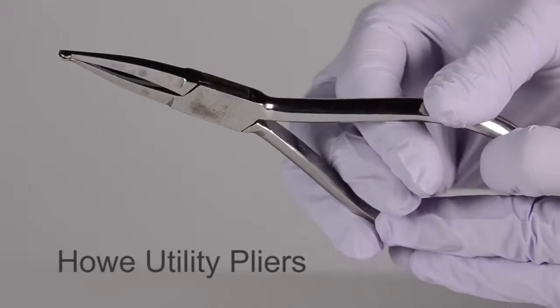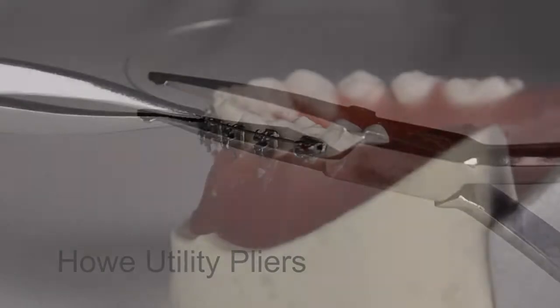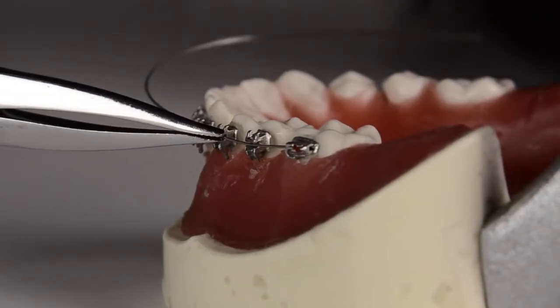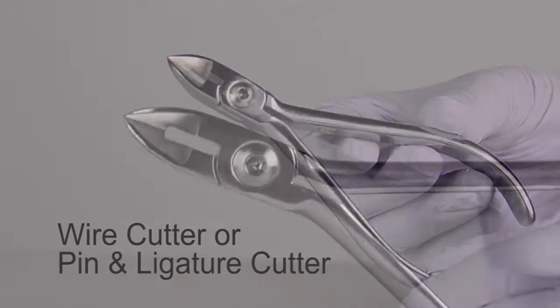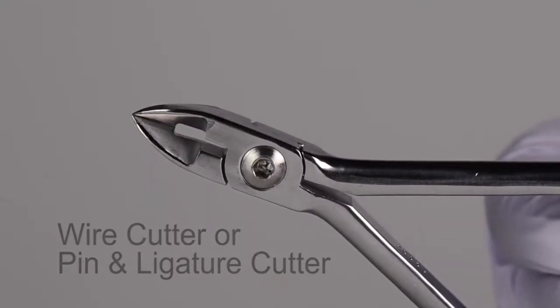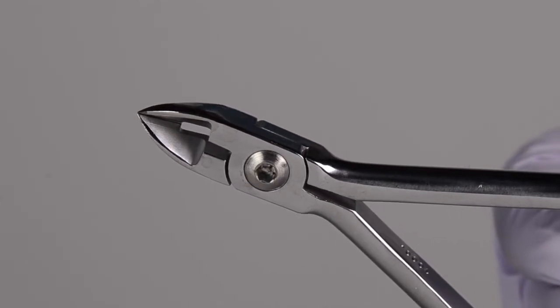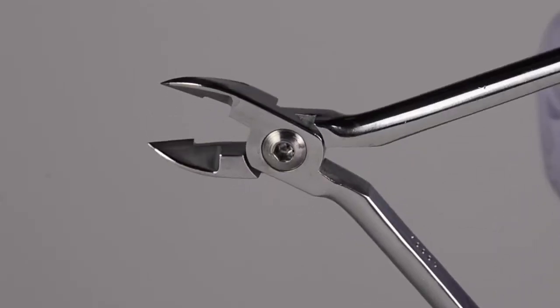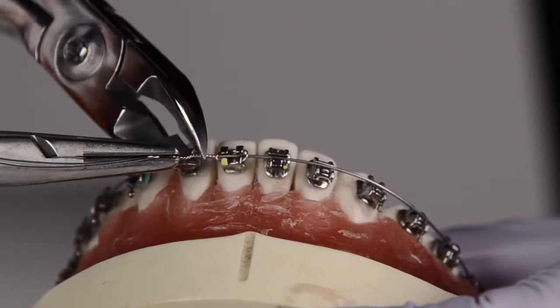Howe utility pliers have two long beaks with pads at the ends that are used to hold arch wires during placement and removal. A wire cutter, or pin and ligature cutter, has two tapered beaks with sharp cutting terminal ends. The tip of the sharp end is used for cutting small diameter wires, less than 0.015 inches, and for cutting stainless steel ligatures.